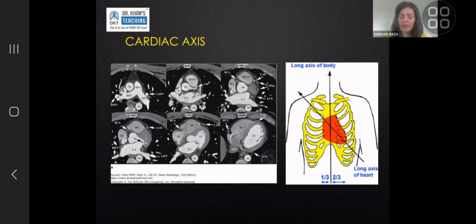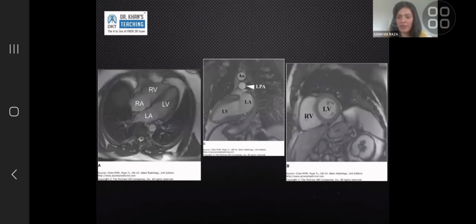So you have to be aware that it always shows you the crosshairs of the axis along the left heart. You can do it along the interventricular septum. You can do it perpendicular to the interventricular septum. So you have to create those views, and only in views that look like this can you accurately measure the chambers of the heart. Only then can you accurately give the wall thickness.